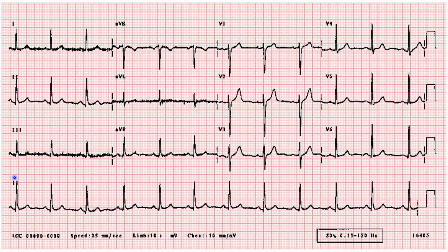At the bottom, they'll usually put a rhythm strip, which typically will be lead 2, but sometimes it'll be more than one or a different one. That's just to give you a longer reading of one strip if you need more than just here. So if you see this only gives you like 3 QRS complexes, here you have a much longer strip that can be helpful for analysis. And so these are your 12 leads up top, and then you have a long rhythm strip down here.